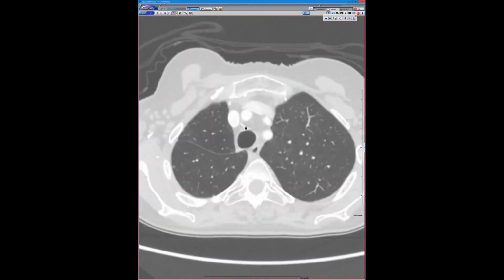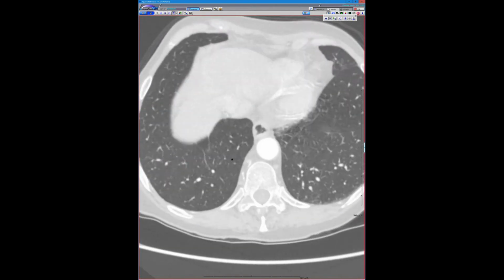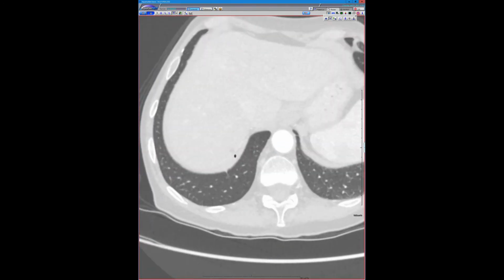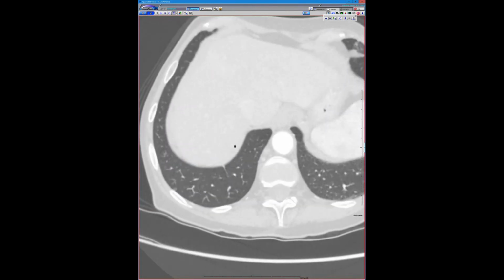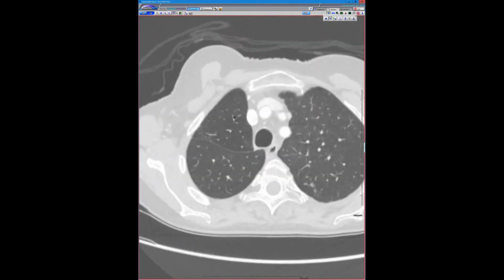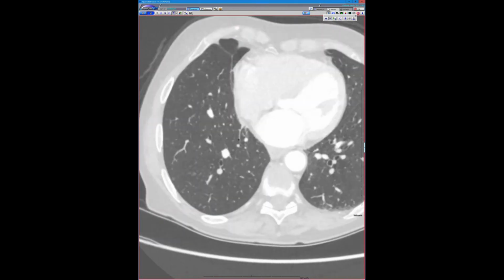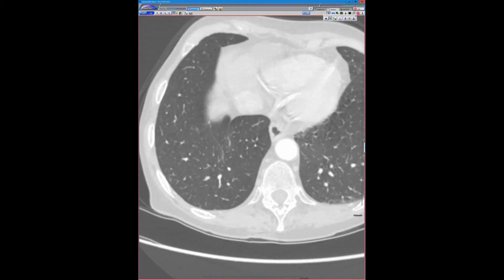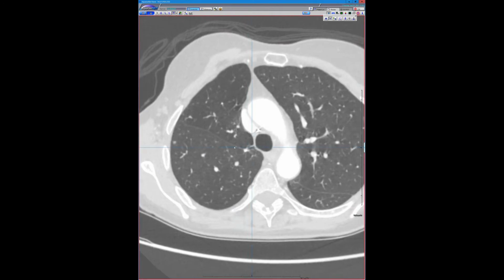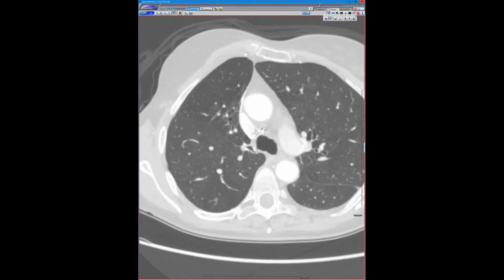That's awful. Nice that you have the path. It's nice that there was a lobectomy specimen that showed those nodules. Yeah, because first I was thinking, oh, it's just going to be multifocal adenocarcinoma, but no, these are too small. They're little Cheerios. And then I went back to the study in 2013, and they're essentially all there. Although the shift in the lung drives me crazy trying to figure it out. And then there's this solid nodule up here that sprouted up, and there were some other ones that are a little more solid.